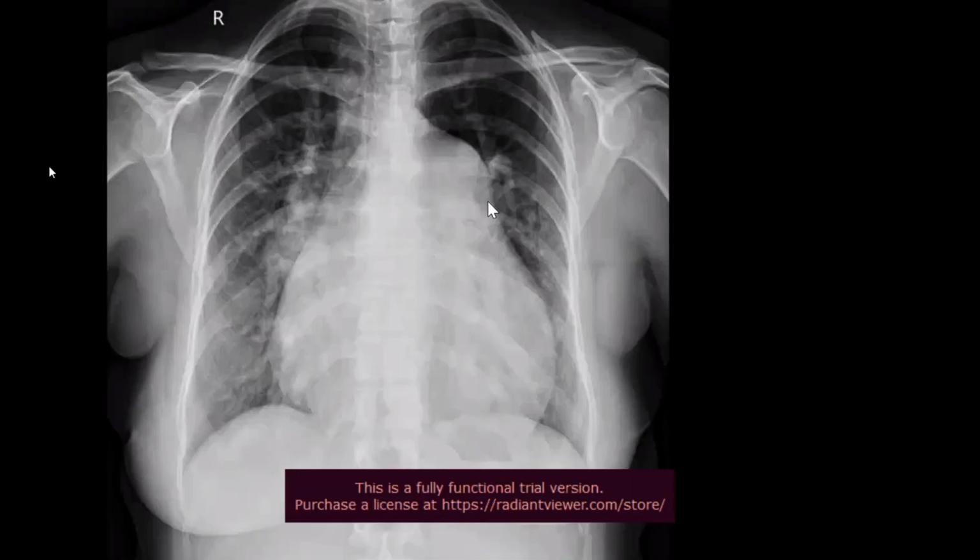This was just to show you one of these cases: pulmonary arterial hypertension, pulmonary venous hypertension, atrial septal defect, ventricular septal defect, in peds, and the cardiology cases of mitral valvular heart diseases in adults. The differentiation of arterial and venous hypertension is shown in OSCE, TOACS, as well as Viva. So you must get familiarized with the appearances of all these pathologies on plain X-ray.